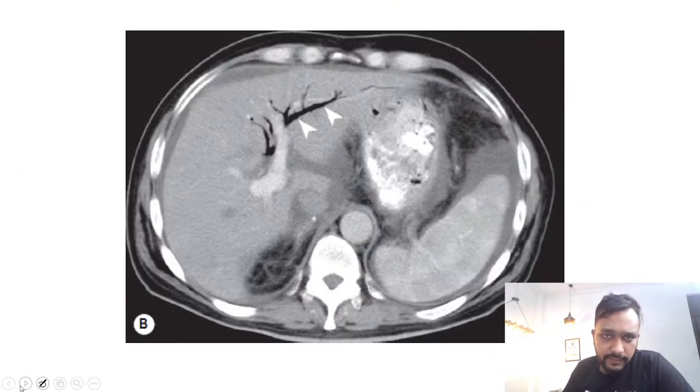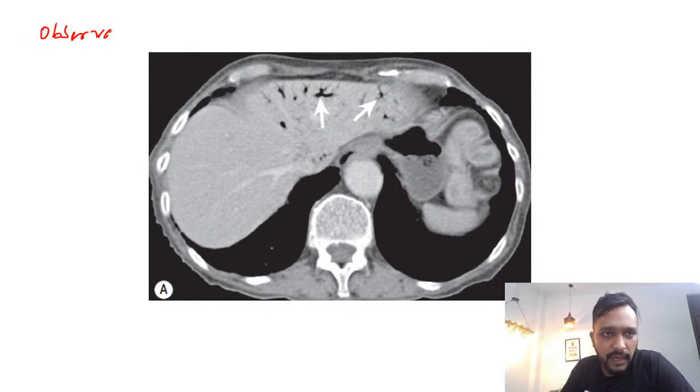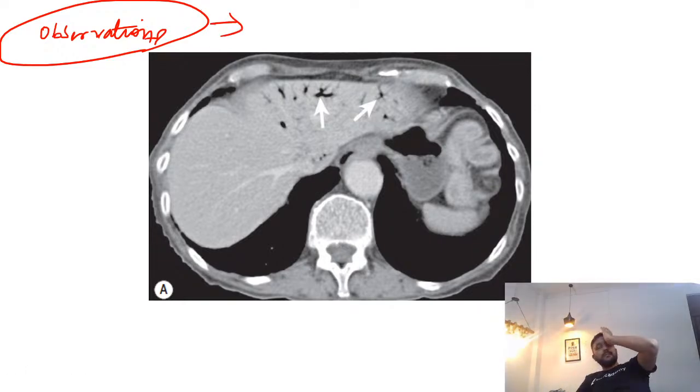Chronic liver disease. Now guys, moving on to a few other images. So first of all, tell me, what are your observations in this case? Anyone? Very good, Dr. Kama, right?